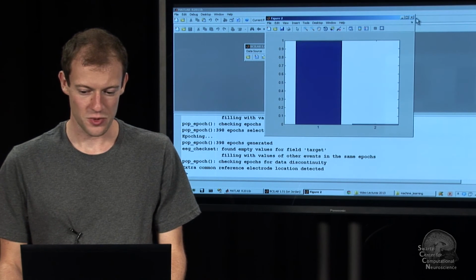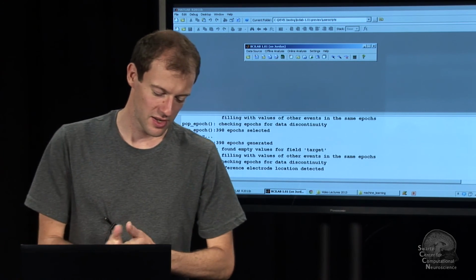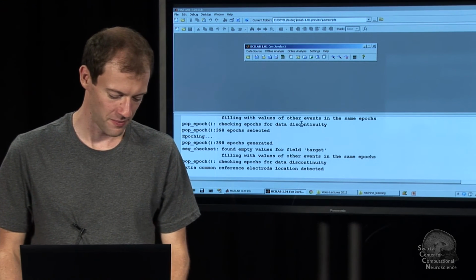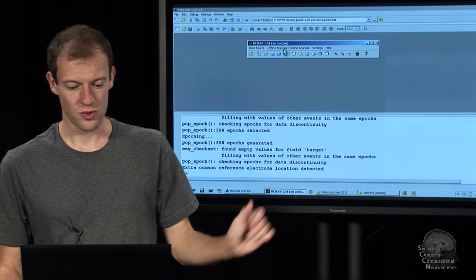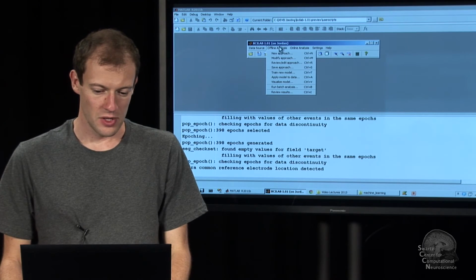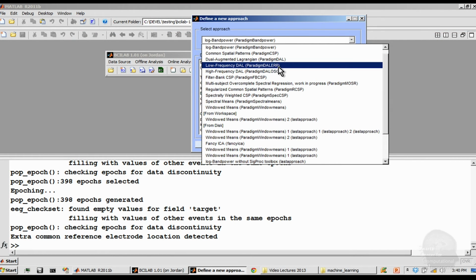Also, logistic regression is one of the few really proper probabilistic classifiers. LDA isn't really; the output is the distance from the hyperplane, so to speak. Logistic regression is giving you something that you can actually interpret as a probability. Anyway, and now I could go on and do a comparison of this method and the other in my batch analysis or things like that. So it's basically the same story if you use any other paradigm. So for example, you could use this paradigm DAL ERP, which is the very advanced ERP analysis, but it would run much longer.